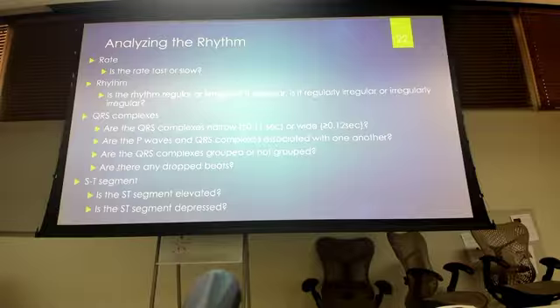We have to make sure we have P waves that are before the QRS complex. They should be married together. I have a P, I have a QRS. I have a P, I have a QRS. We've got to make sure that that is the case.